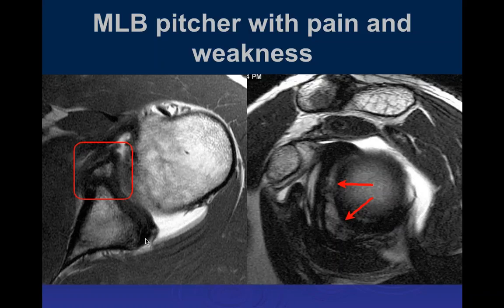Looking at that, see the signal across the glenoid, is that labrum or is that thickened? Basically going all the way across the glenoid, that dark signal. Sorry, that's articular cartilage. That cartilage would be thickened, right? No, it's normal cartilage. And then here we can see this would be partial volume of the curving labrum, and then this is the labrum and the ossicle anteriorly there.